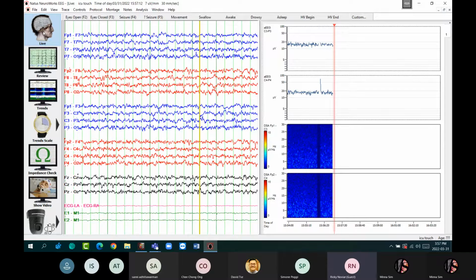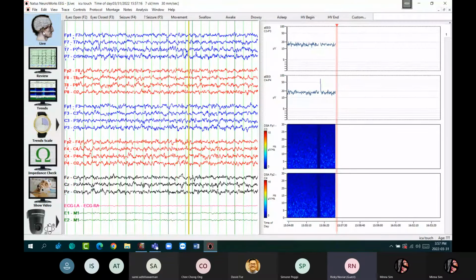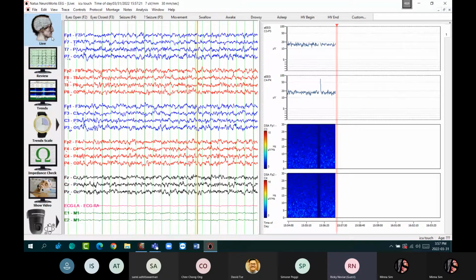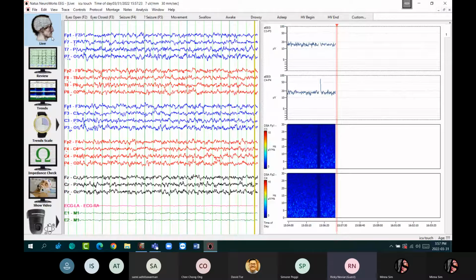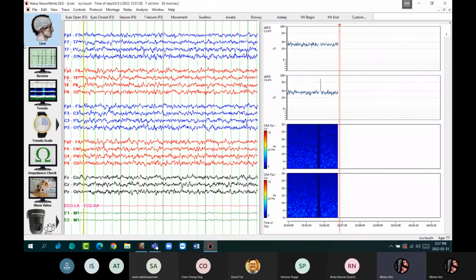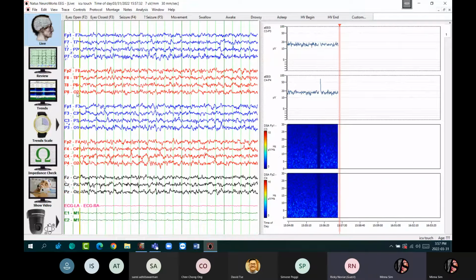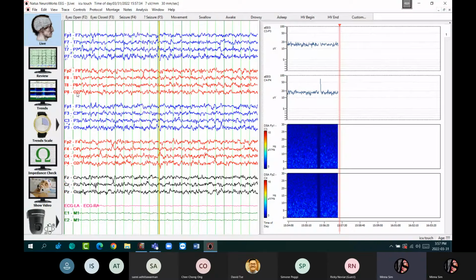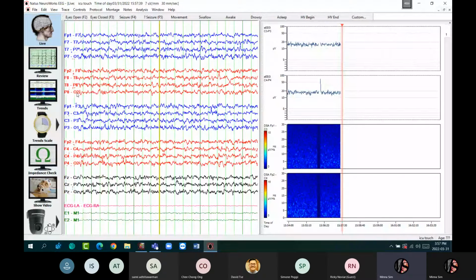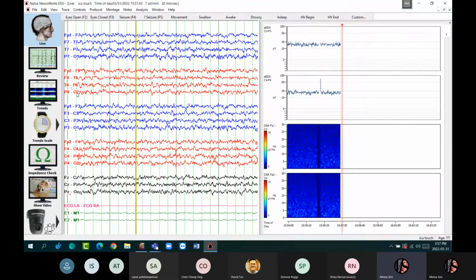Hello, Nina. Yeah. So this one is made for displays using the touchscreen, right? For the second monitor, right? It can be used on a normal screen as well. It doesn't have to be a touchscreen. The touchscreen is to allow users to press the buttons on the screen to change it without using the mouse. That's the main difference.